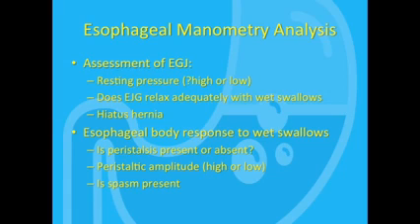Secondly, we want to assess the esophageal body response to solicited wet swallows. Is peristalsis present or absent? Is the peristaltic amplitude high or low? And is there evidence for esophageal spasm?